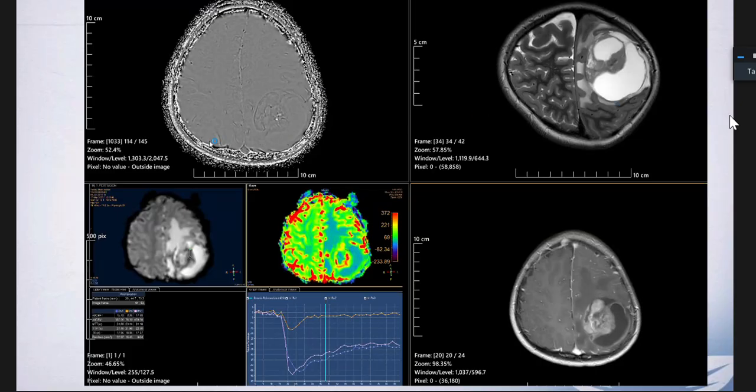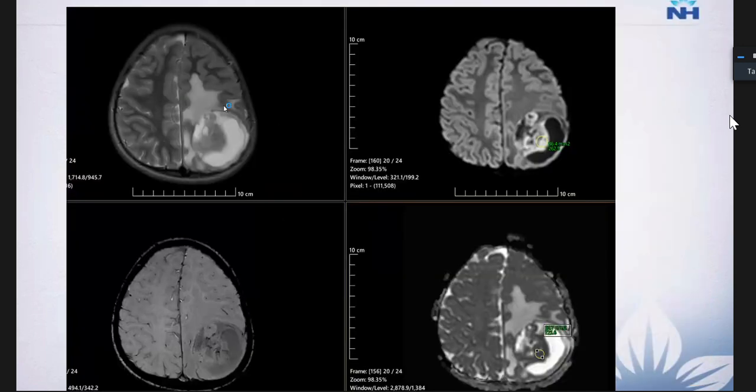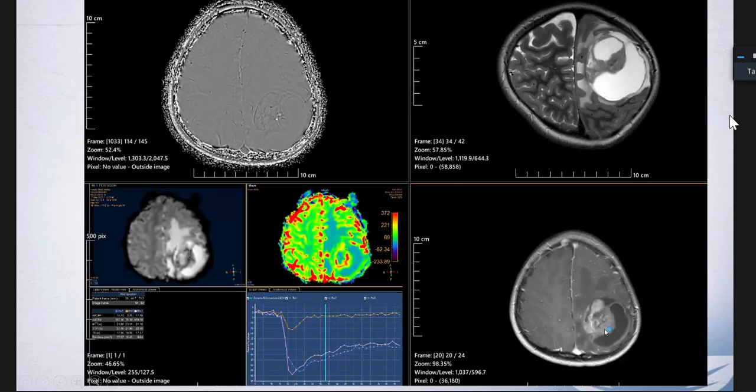So it was looking like more of a high grade lesion, which was having areas of microhemorrhage plus calcification. It was having this kind of disproportionate edema. You can see that usually the low grade tumors do not have marked perilesional edema, but in our case, you can see that there was disproportionate vasogenic edema. And on post contrast images, you can see that the solid areas of the lesion were showing heterogeneous enhancement, and the periphery of the lesion also shows enhancement along the walls.